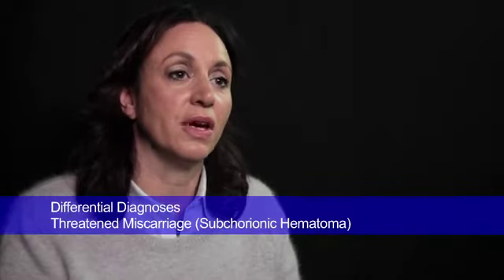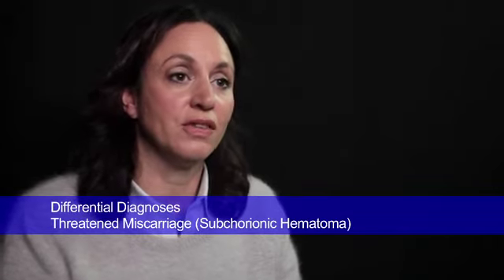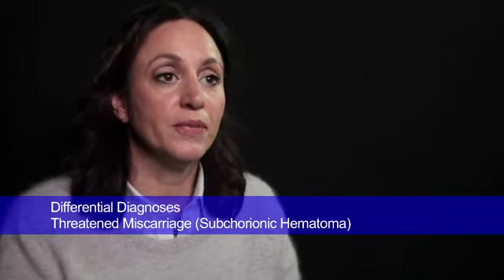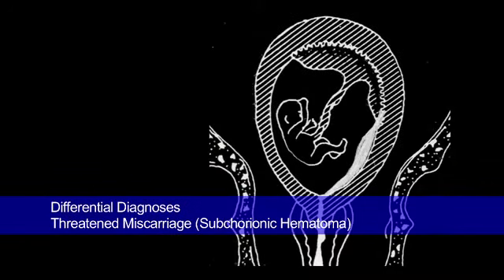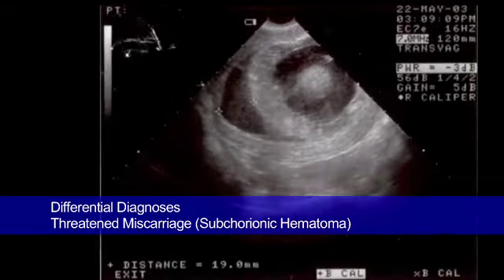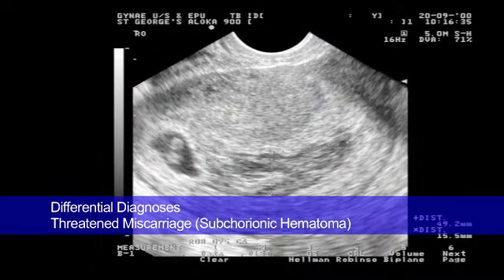A threatened miscarriage, again, is frequently a clinical diagnosis backed up by ultrasound findings. A threatened miscarriage represents the situation where a pregnant lady with a positive pregnancy test is admitted to hospital complaining of bleeding, and we scan the pregnancy and find that there is a heartbeat, the embryo is still alive. However, there may be a large hematoma, classically a subchorionic hematoma, and we may feel that the pregnancy, although at that moment in time ongoing, is threatened.